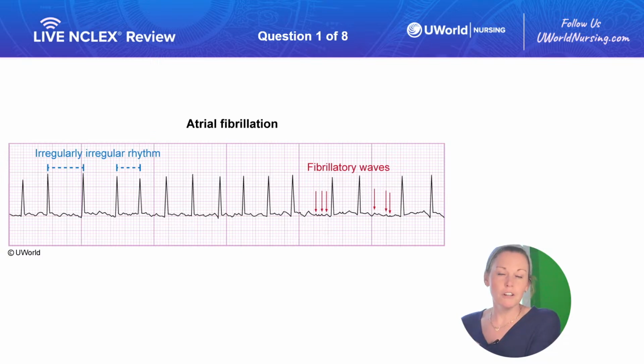So our ventricles are larger, they're going to require more electricity to contract, so that's why you're seeing those higher peaks. What we see in our P waves is the electrical activity of our atrium. Our atrium are smaller and are going to require less electricity to contract. So you can kind of see what we're seeing.